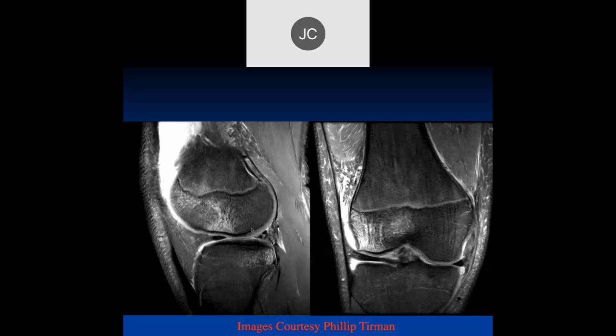And it comes back in this part, this anterior articular surface of the lateral femoral condyle impacts the posterior aspect of the lateral tibial plateau, and you get these kissing injuries caused by a pivot shift mechanism. That's due to the ACL tear. The femur shifts, rotates, and pivots posteriorly and impacts back here. So you tend to get impaction injuries of the lateral and also the medial tibial plateaus.